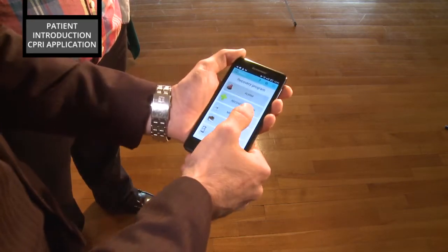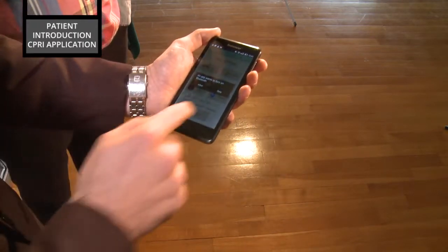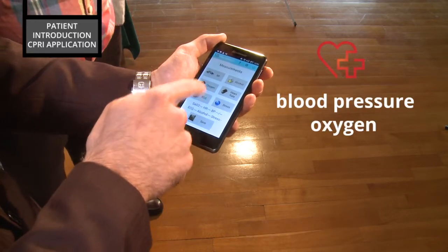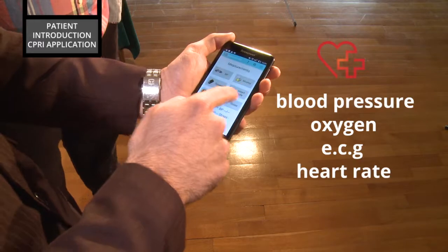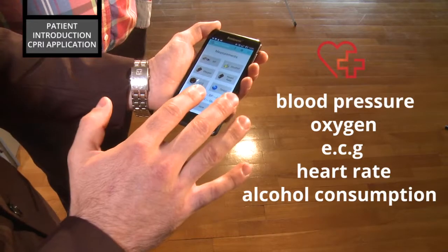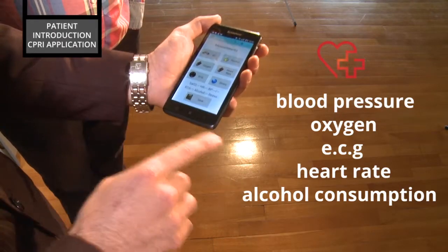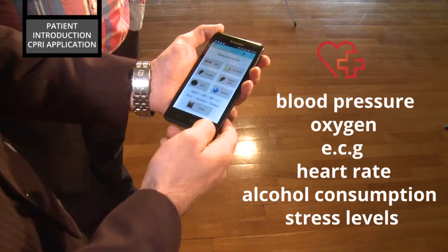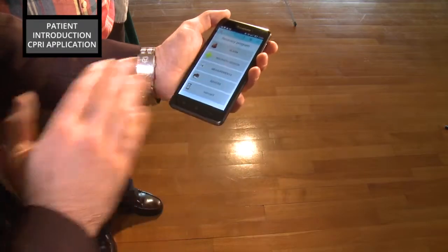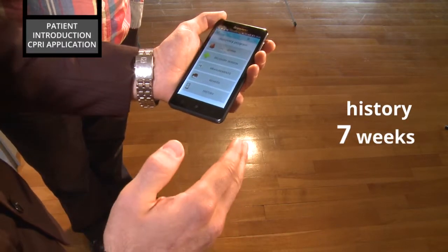Also, he will have the possibility to take measurements independently whenever he wants: blood pressure, oxygen saturation, ECG, heart rate, alcohol consumption, which is risky for the heart so it should stay at normal values, and also the stress levels of the patient. He will have a whole history of his trend from the beginning till the end of the 7-week rehabilitation period.